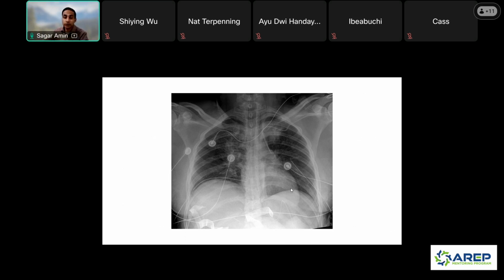So a few things to look at. Of course, if you had prior imaging, you can rule out if they have a partial anomalous pulmonary venous return or if they have a prominent superior intercostal vein or a left SVC. But without the imaging, you can also help narrow the differential depending on where the tip is. If it's coming down along the aorta, obviously, you'd be wondering if it could be arterial. In that case, you'd be getting arterial blood back when you're drawing back on the line. Or if it's close to the aorta, it could be in the intercostal vein or a left SVC.